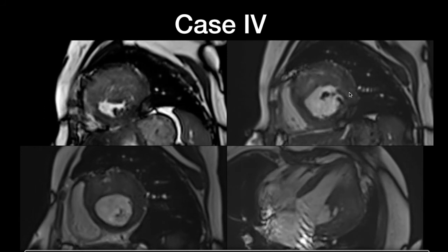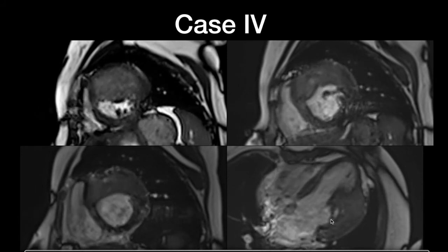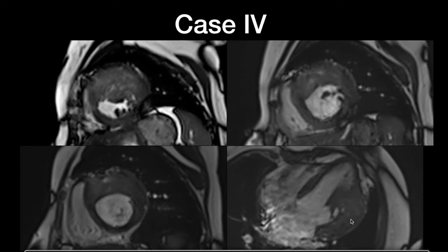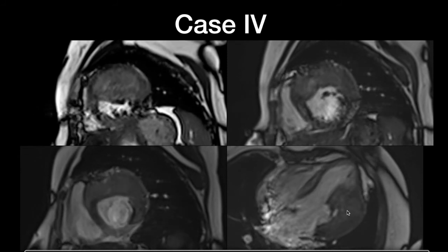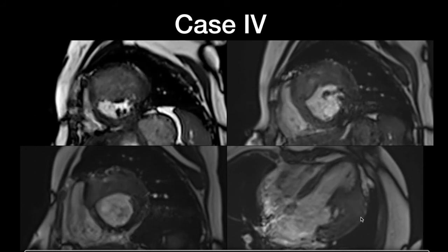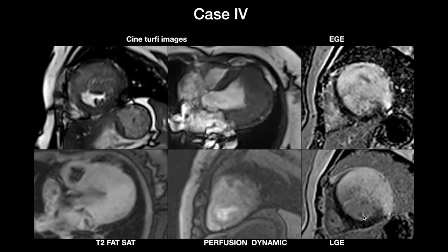walls from the base to the mid-myocardium, sparing the apex, with transmural involvement throughout its involved myocardial segments, with mild pericardial infiltration along the lateral wall with minimal effusion. How are the margins? The margins are ill-defined. T2-weighted images are showing increased signal intensity.